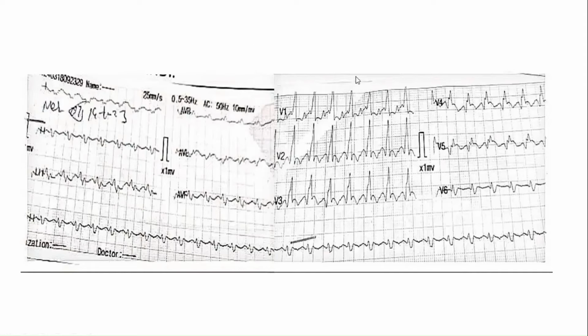Okay, so this is a tachycardia. There's no doubt about it. Can you see P waves before these QRS complexes? Any discrete P waves? You could say this can be a sinus rhythm going on. Look at the heart rate. Look at the rate of this tachycardia. It's around 160, 170 probably. So it's pretty fast.